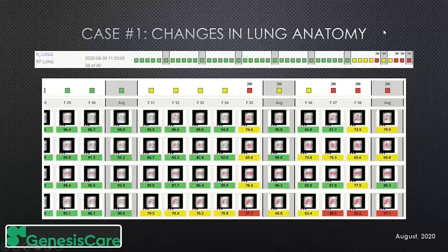Now, for those of you that are familiar with the Adaptivo software, for each treatment plan for each patient, you get this bar that has these little squares. We refer to these commonly as the chiclets. As you can see, for the first 6 weeks of treatment, everything looked fine. Green means above tolerance, so we were passing above our set threshold. And then all of a sudden here, we start to see yellow, and then on the end, red, which are true failures. The yellow is considered borderline tolerance, and the red is considered a true gamma failure.